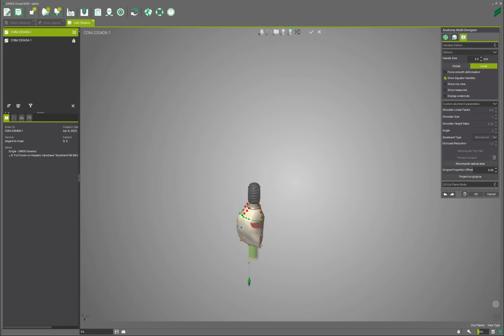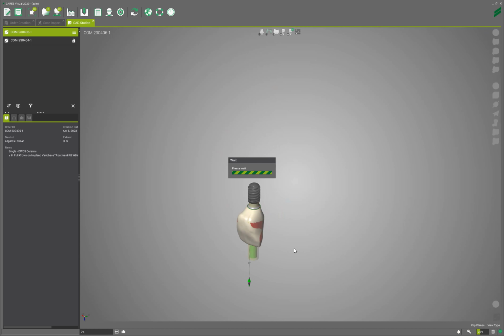And if I say okay, that's what I have. And I'm just gonna smooth it up a little bit.